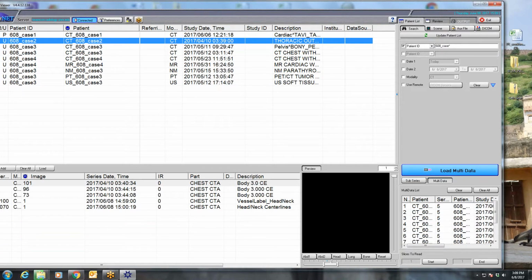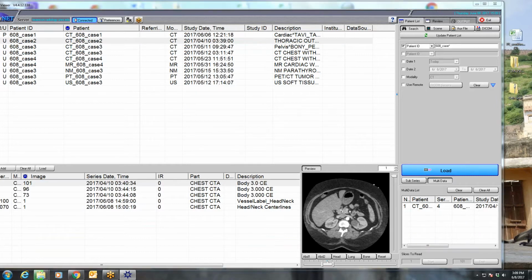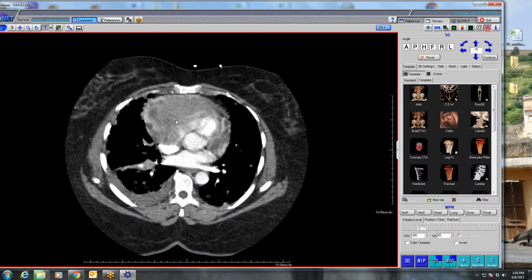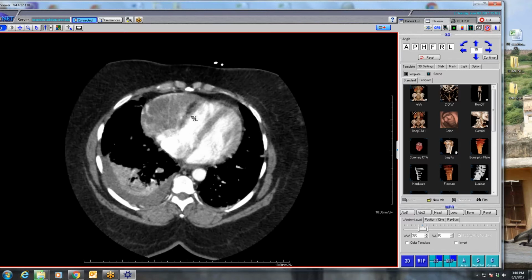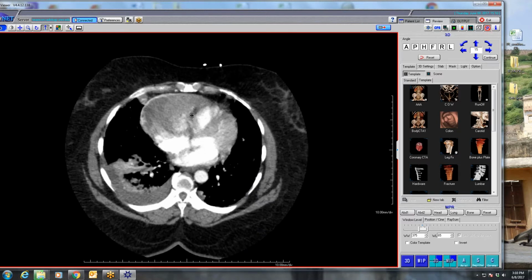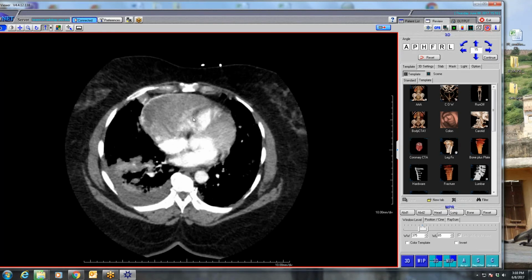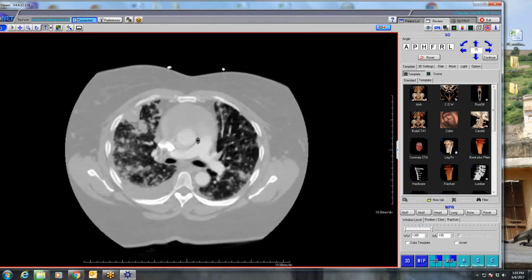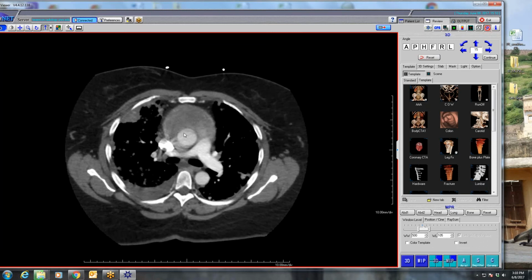Oh crap. Okay. I wanted to email. So I got beautiful gross path on this case. This is a woman who came in from an outside hospital. I apologize, the scans aren't great because they're from an outside hospital, but she comes in basically with tamponade, has this very large, ugly mass sitting what looks like to be in the pericardium, kind of squishing the right atrium, and also has all of these very vascular metastases. If you notice, there's a lot of vessels coursing through this lesion.